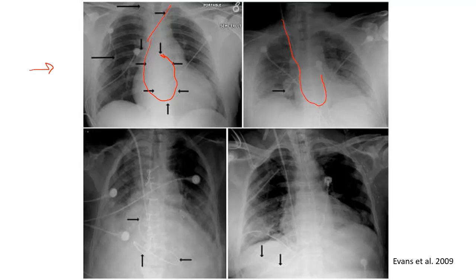On the top right, we have an example of a PA catheter that is too distal. It's coming up, going through the PA, and then it's far out in the periphery. Generally what we're looking for is that the distance from the center to that tip be less than 5 centimeters. Anything more than that, we're too distal. We could be in a small artery, and we're at risk: if we blew up that balloon, that would be too high of a pressure. But also the catheter itself could occlude that vessel when the balloon is not inflated, and that can lead to things like pulmonary infarct.